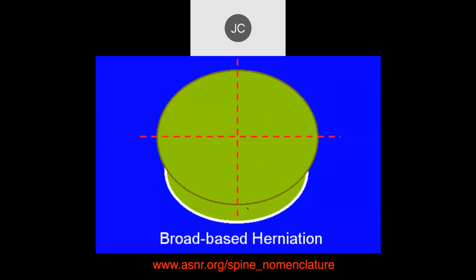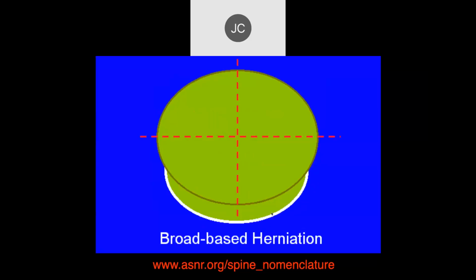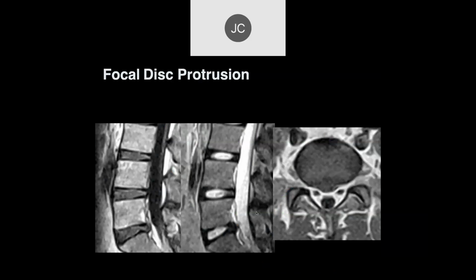This would be a broad-based disc protrusion. And the concept at one time was these focal protrusions might be more significant from a surgical standpoint, which we'll talk about, but these broad-based protrusions really aren't surgically accessible lesions. And then there's a focal herniation.